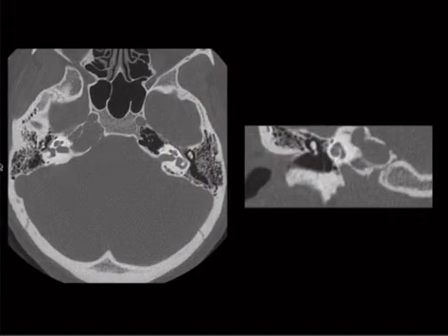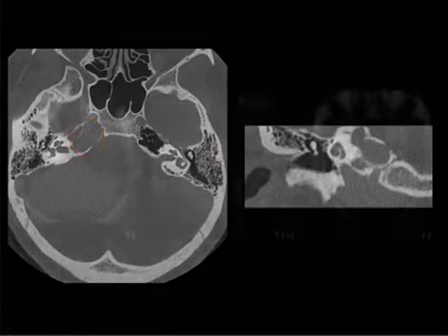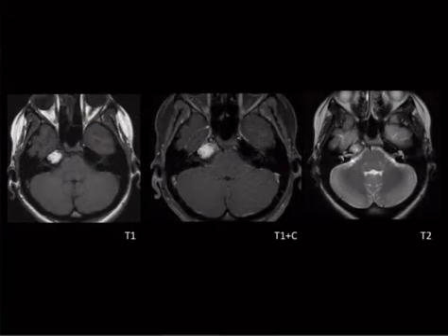Not going to show you normal with this one. It's too big. So this thing right here, boom, right here and here, what's that part of the bone called? Petrous apex, right? The apex of the, it's eaten out right there. So a big hunk of bone missing. Now here we go. So we've got T1, white matter's white, T1 post-con. You can sort of see the nasal mucosa, they're cutting off the front part there. And then T2. So we've got a mass here that's both T1 and T2 bright.